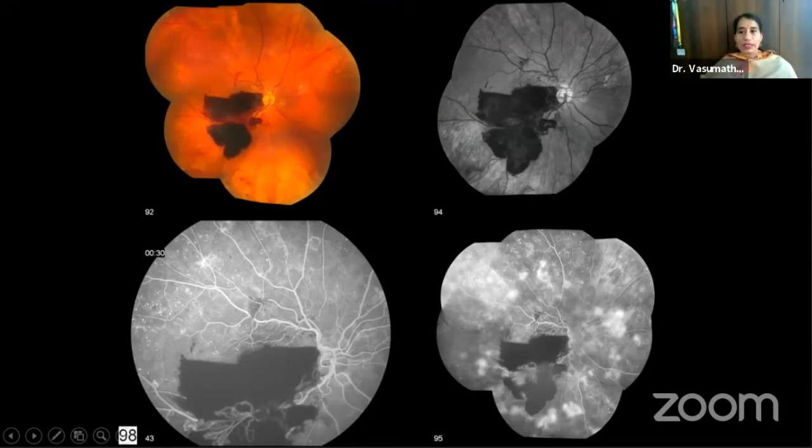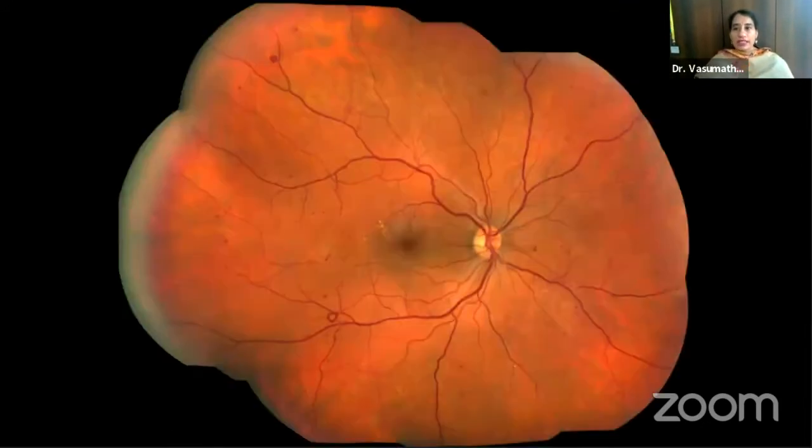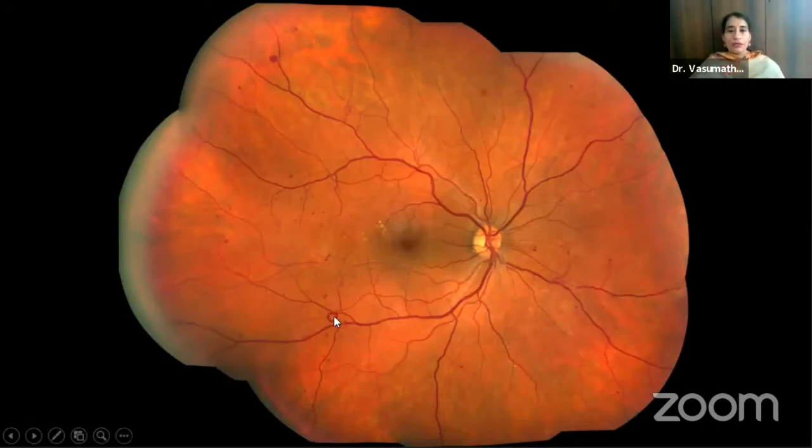So the clinician basically needs to use his or her judgment in ordering the test for fluorescein angiography, because it's an invasive procedure. And this is also, obviously, a proliferative diabetic retinopathy with a new vessel and a few microaneurysms. It's a good montage, but we would also like to know the extent of peripheral ischemia.